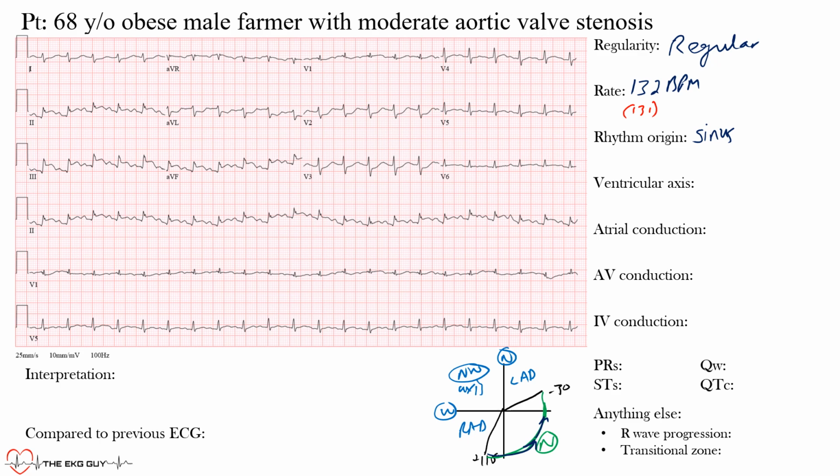So let's look here. So here we have lead 1 and lead AVF. And we say lead 1 because lead 1 sits here and AVF sits down there. Okay, so let's draw it out here so it's clean. So lead 1 and AVF. There are many ways that you can find the axis, but we will use these because it's quite simple, okay? And let's look here. So what we want to do is look at these leads that we've pointed out. And we want to look, are they mostly positive or are they mostly negative, okay?